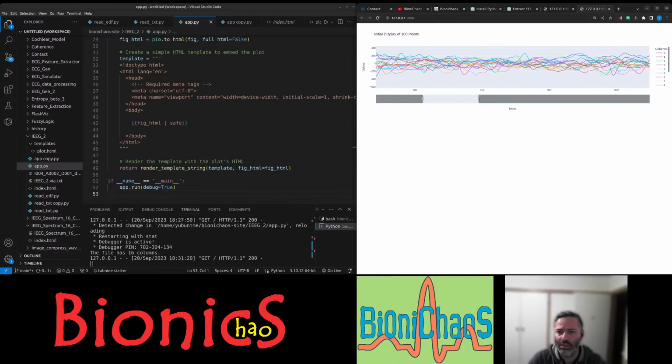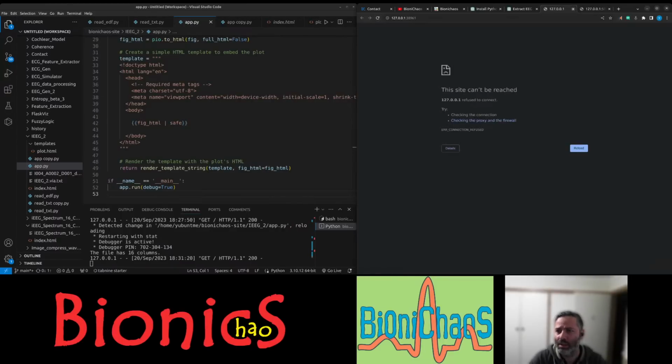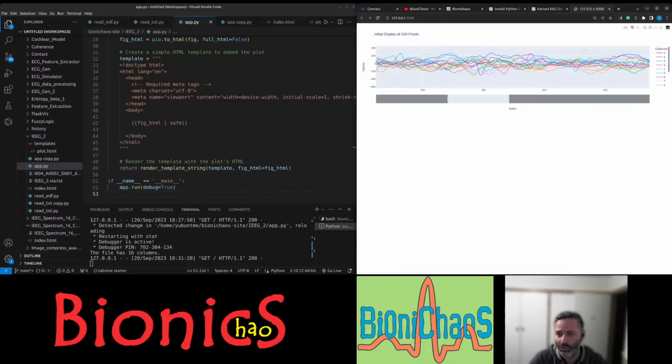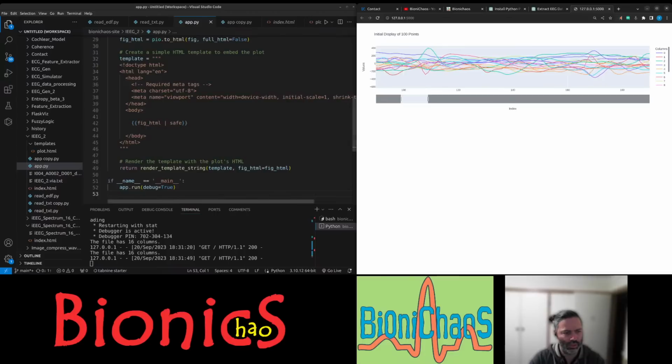Right. So this is better. Just double check. Ah, that won't run again. No, that's just the one off. This one should be just sitting there for good.